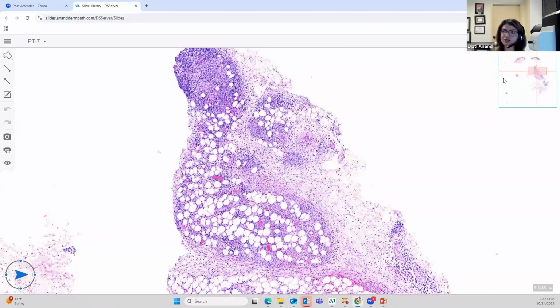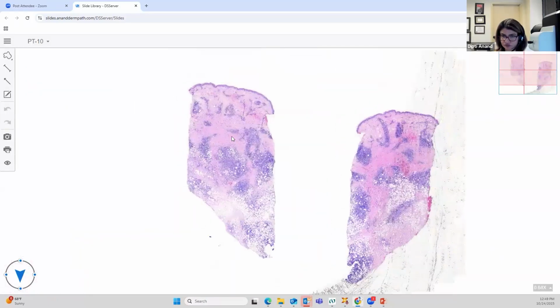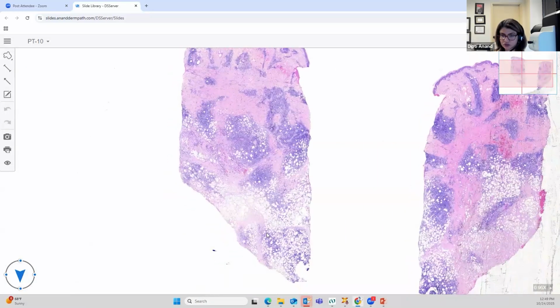So that's about E. induratum and PAN when you see a vasculitis with a lobular panniculitis. Now, what happens if you do not see a vasculitis and you just see the lobular panniculitis? Now, that again comes to the pattern of fat necrosis. Okay, so now let's go into this slide. So here you see lots of inflammation. That's the first standing feature. And you obviously see lobular panniculitis.